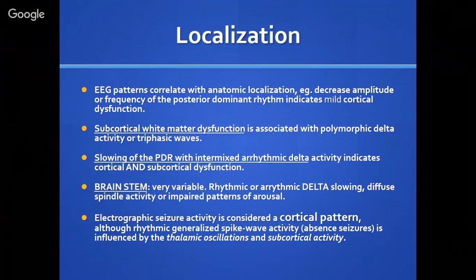So this alpha-level activity is strongest in the occipital region, and it gets weaker as it goes to the anterior region. There's the anterior posterior gradient in this alpha rhythm, and the alpha peak is moving to a lower frequency range. Yeah. Okay. So it's fine.